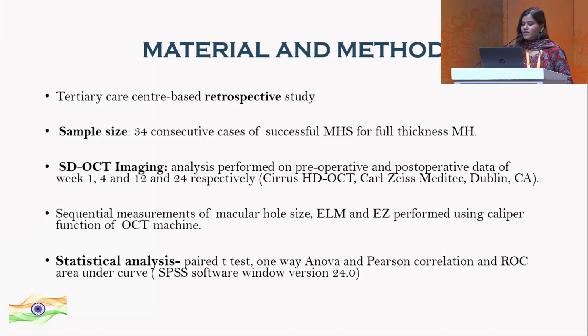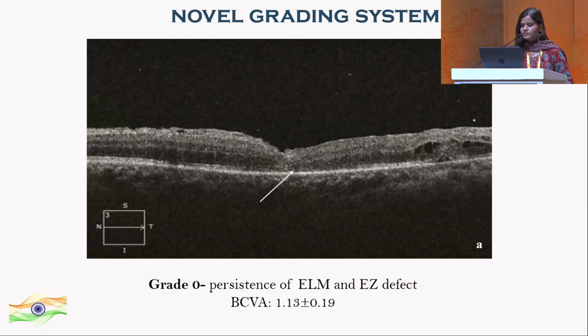SD-OCT imaging analysis was performed on preoperative and postoperative data at week 1, 4, 12, and 24 respectively. Sequential measurements of macular hole size, ELM, and EZ were performed using the caliper function of the OCT machine.